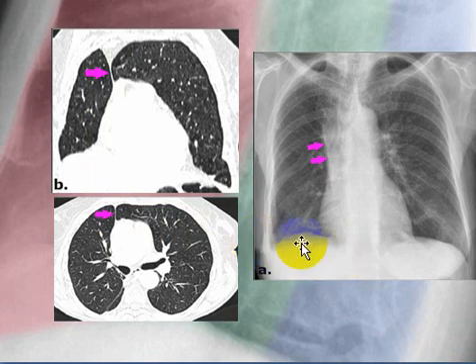The patient has had a partial right lower lobe lobectomy, and we see some changes in the right lung and in the ribs, and the right lung is small compared to the left lung. The anterior junctional line is deviated to the right side by hyperinflation of the left lung.